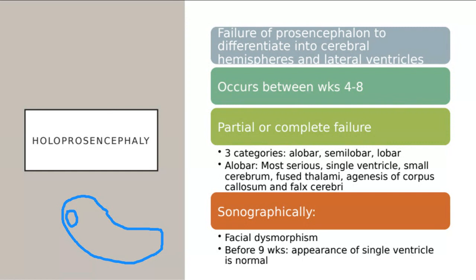That's actually a good sign that we want to see in the first trimester ultrasound, because it means that all of these encephalons are developing and differentiating at that point. So if you ever see that cystic, small posterior region of the baby's head in a very early ultrasound, that's your rhombencephalon, and that's a good sign that the brain is developing the way that it should.